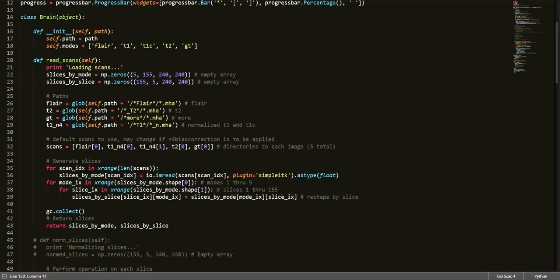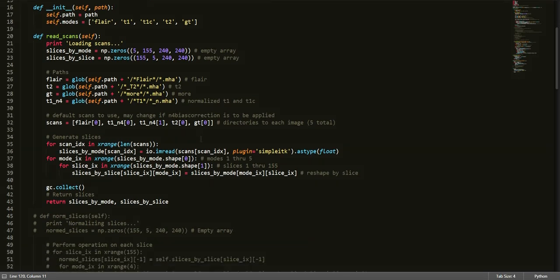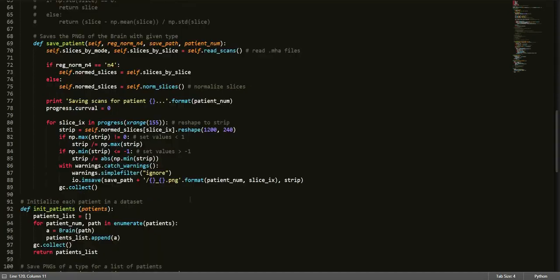Each of these variables reads the different kinds of files, and then we simply perform the extraction process and stack them on one another to create that array of 5 images. Then we simply use the path and store it in .png format, as we can see right here.